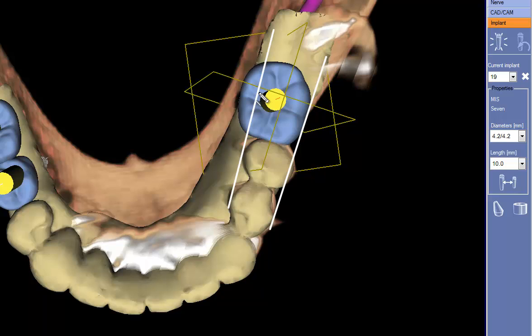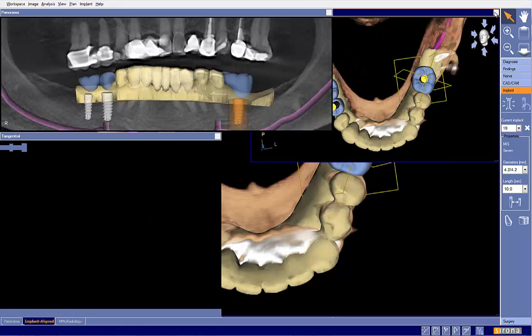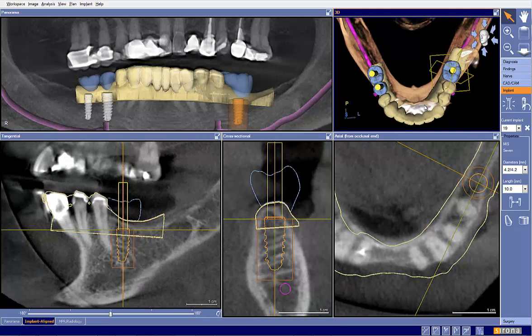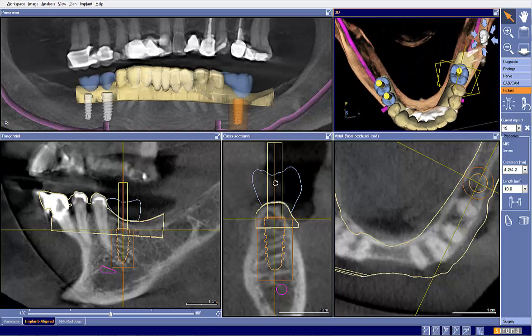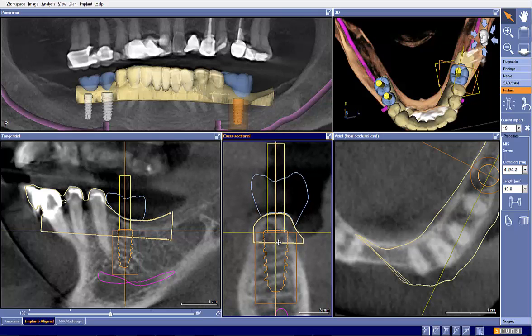So again, this goes back to the principle that I harp on of making sure that our implant or restoration design is accurate, and then again accurate in terms of also the size of it here. So I would say that actually our tooth probably needs to end about right here. So we are definitely a little bit to the lingual. So I would go ahead and move this right here to the buccal, and then I would go ahead and tilt this out just like so to give us a better emergence profile there, like so.